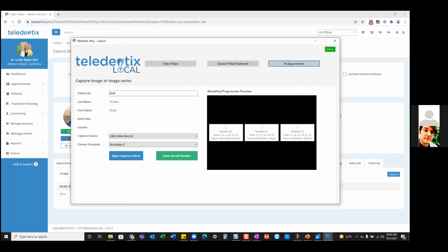All right. But don't forget, let's just say you don't do that. Let's just pretend it didn't happen. It may happen, right? It's okay. Remember, we have the offline add appointment. The only thing there is you are going to have a little bit more work once you get back online, because you added all of those new appointments offline, and Teledentix is recognizing them as, whoops, they didn't have an appointment, maybe they're not a patient. So you are going to have to do that manual syncing process where you match it up to the current chart that you have in there.